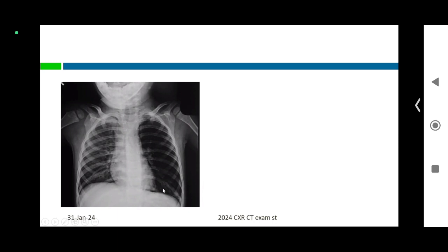You are able to see the bronchovascular markings in the lower aspect. So this means air is inside the lung and getting trapped. This is an emphysema. So what can cause an emphysema? How do you make out a diagnosis? How do you treat? Common things common: foreign body aspiration, getting lodged in the left main bronchus, having a valve-like type of obstruction leading on to an emphysema.